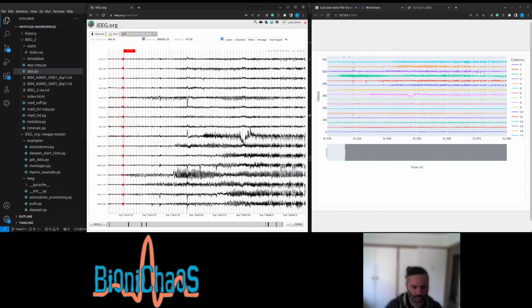So right one is the one with the deep, so it must be this one here.